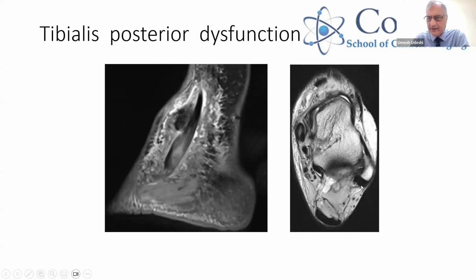And the peroneal tendons are here just behind the lateral malleolus. And then in the extensor tendons, there's one of them shown clearly, probably another one there, perhaps another one there. So the extensor tendons at the front. So I always look at it on the axial first, and then I may look at it on the sagittal and the coronal if I want to confirm what I'm seeing.